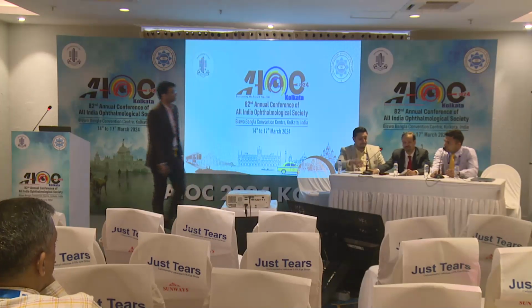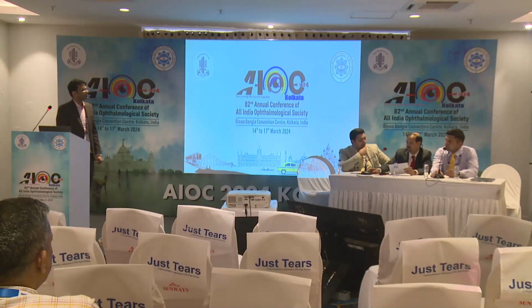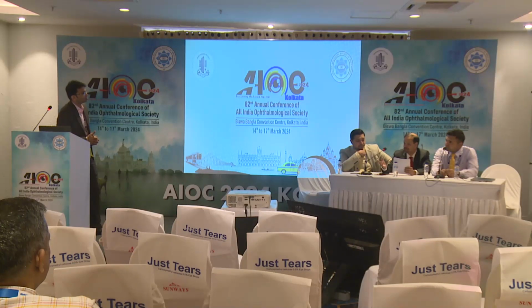Just for the benefit of everyone, you beautifully highlighted how OCTA is done, what are the side effects, you can say artifacts, and then what are the limitations. What are the clinical cases where you feel now you don't need to do FFA at all, but you do only OCTA and it's done?